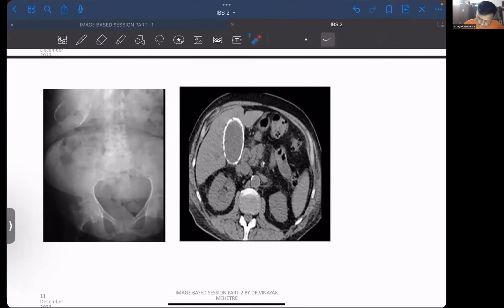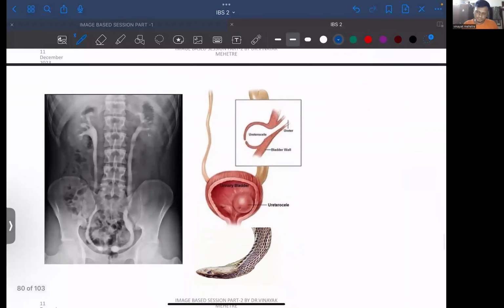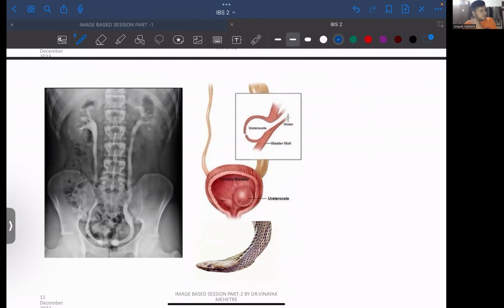लीवर है, this is liver, right, लीवर के साथ क्या होता है, we have gallbladder, now there is a whitish line and defining gallbladder border very correctly, that is called calcified gallbladder, calcified gallbladder, ठीक है. थोड़ा सा बच्चा है, 20-30 इमेज.